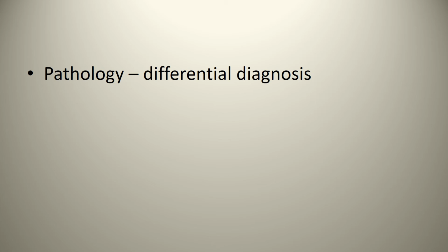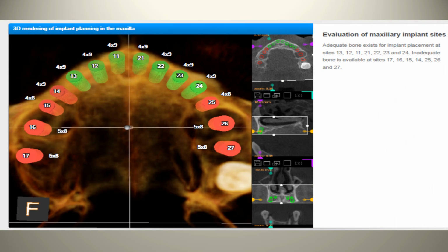So looking at what a CBCT can offer you, this is just a depiction of a patient who we were able to send off to the scan facility, and they were able to give us back this image, which gives us a fairly good idea. I mean, dentists, us being fairly intelligent individuals: green means go, red means no, and yellow means perhaps, just like the stoplight.